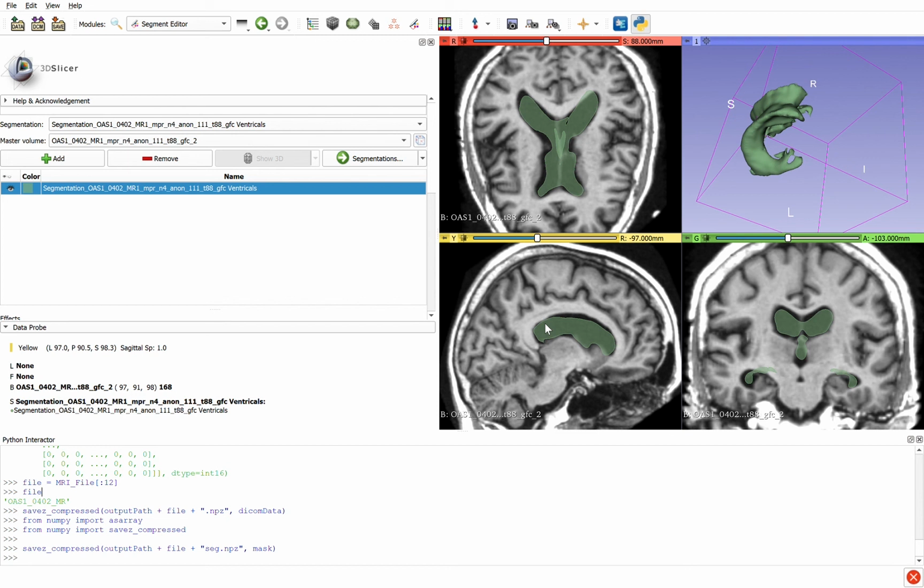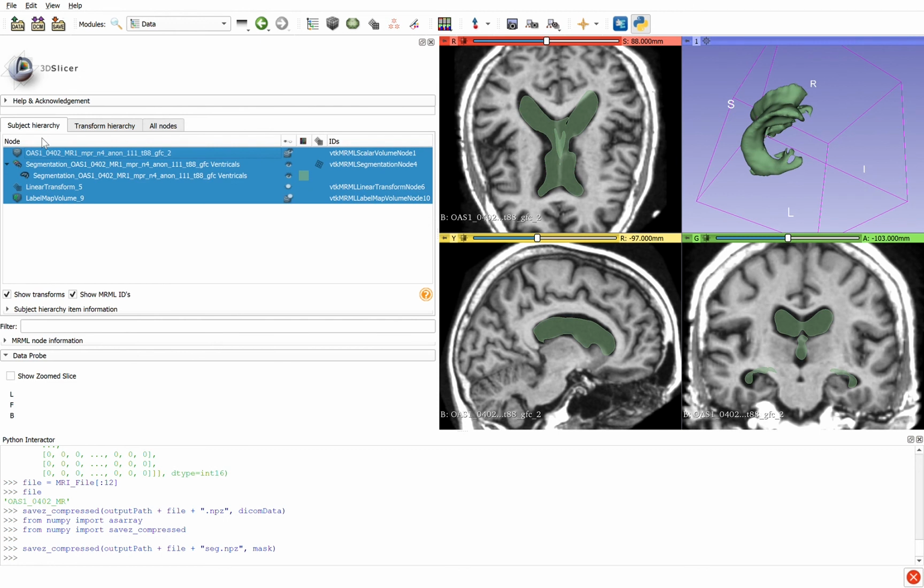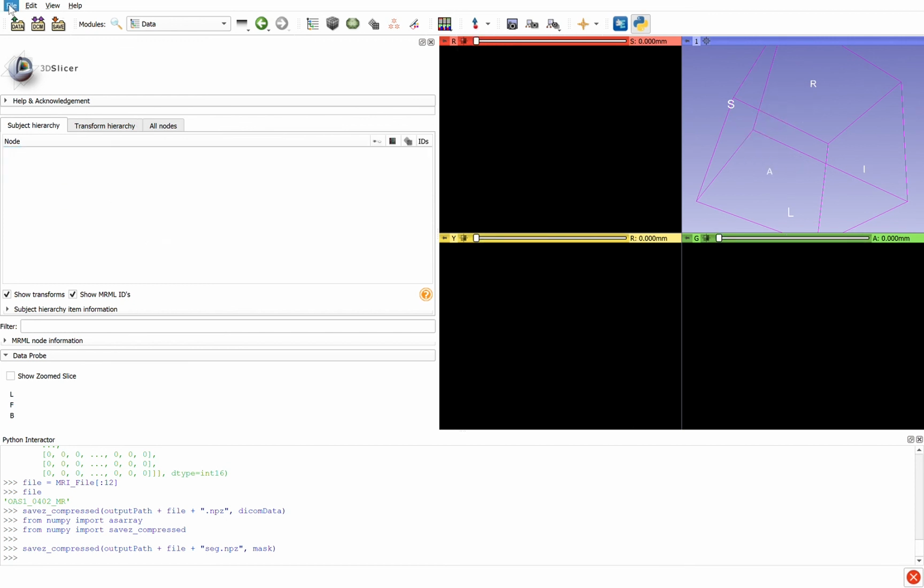Okay, so hopefully that's explanatory. For your next one, you just go back to your data, delete everything here, and start again. And finally, if and as you do more segmentations, I would encourage you to save them out as the STL file, but also after you do the segmentation, you can just directly export it here like we did.